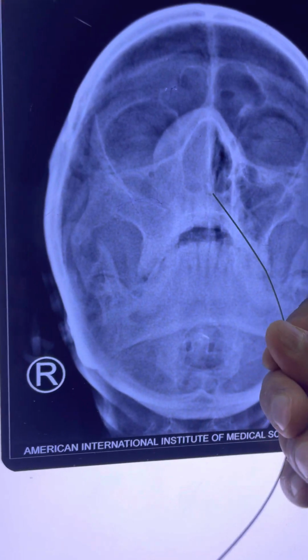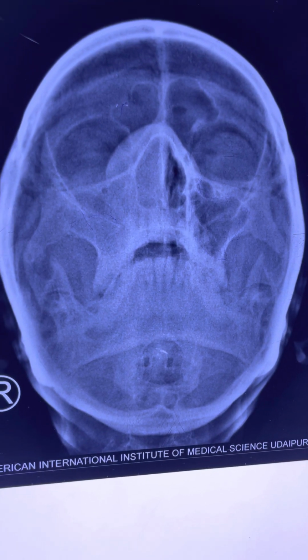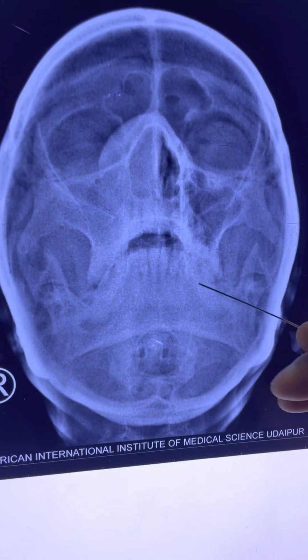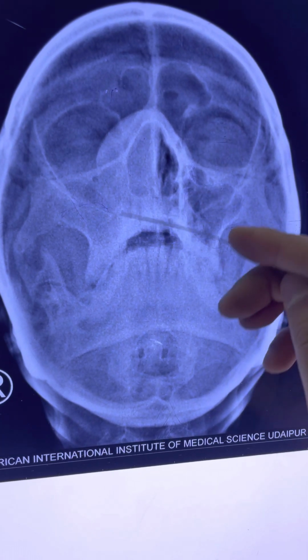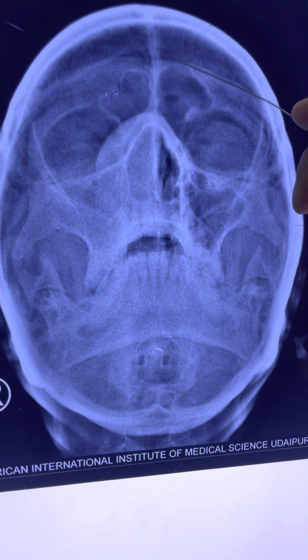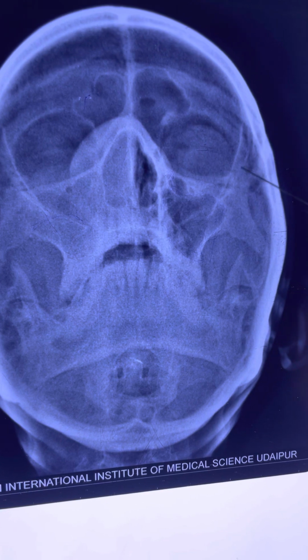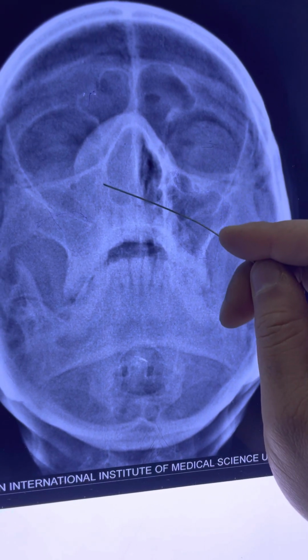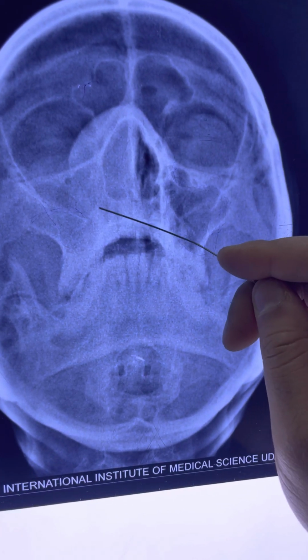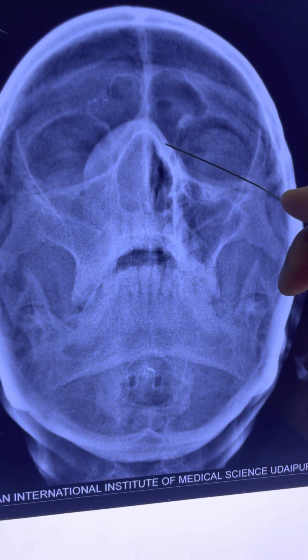Now in this X-ray, I think it is very obvious that we can see that there is a radio-opaque mass in the right nasal cavity. Now once this X-ray is there and something is so obvious, don't jump in your viva to the pathology. You still start with this. This is the X-ray of paranasal sinuses, which is showing the maxillary sinus on the two sides, and it is showing the frontal sinus on the upper part, the nasal cavity with the nasal septum and the orbital margins, which are absolutely normal. But the right side nasal cavity and the maxillary sinus is showing a mass effect or some space occupying lesion, which is definitely not extending to the left side. The left side is showing a good air column.